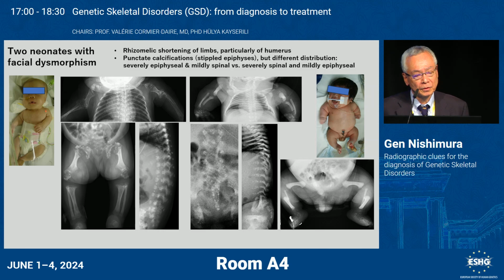But the pattern is different. On your left, you can see severe epiphyseal stippling. On the right, you can see mild epiphyseal and severe spinal stippling.